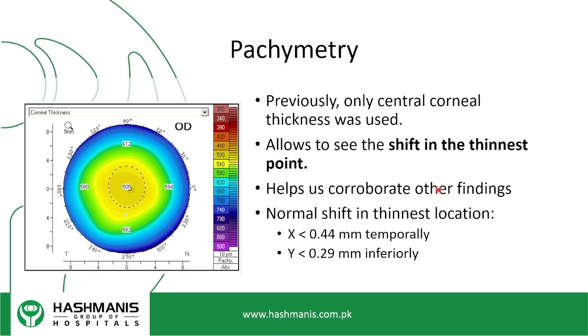If that happens, then you're thinking more towards keratoconus. But remember, pachymetry can shift a lot of places. It doesn't have to be inferior temporal, and even if it's shifted somewhere else, you have to think of other diagnoses as well outside of keratoconus.